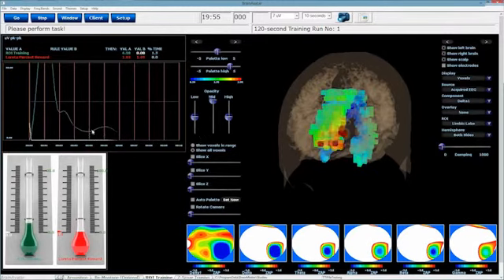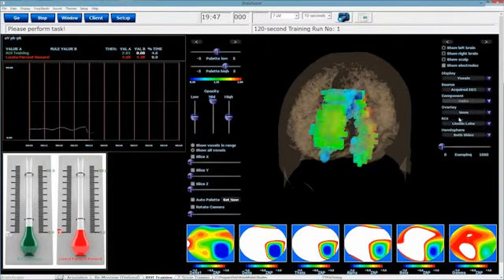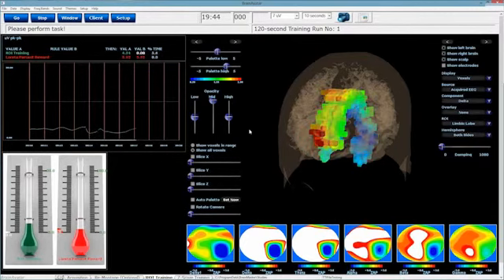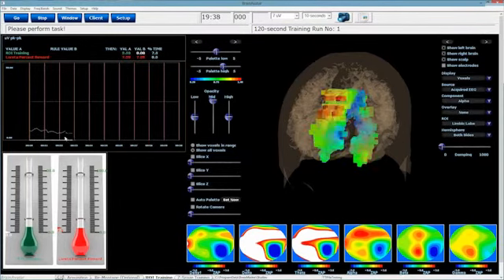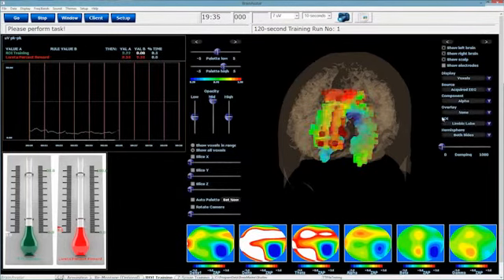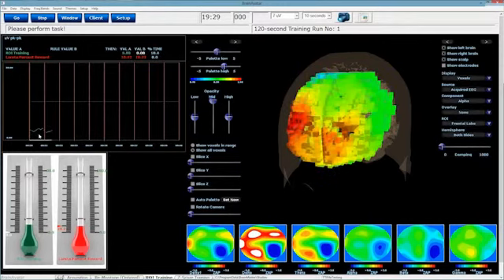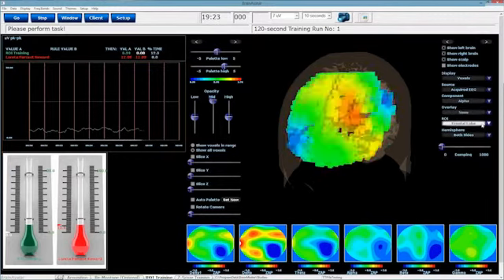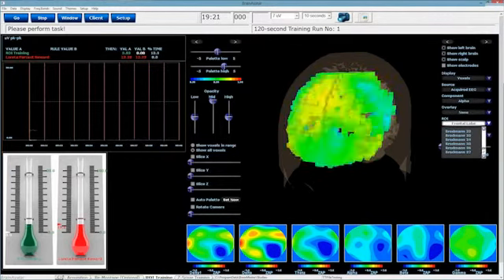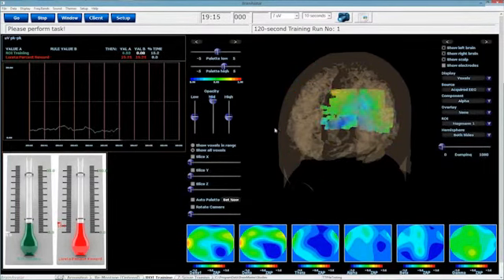All right. So here we go. And so I got my Delta 1 coming in, and you can see it's kind of a slow wave, as it is. And when I hit Delta up, we got a change. It's changing a little bit. If I go to Alpha, that's the data changing right there. And then to go even further, here we go. So you see, as I'm basically doing my select ROI, as I'm changing my ROI, and as I am changing my information going on with it, it is changing in accordance to select ROI and select band.